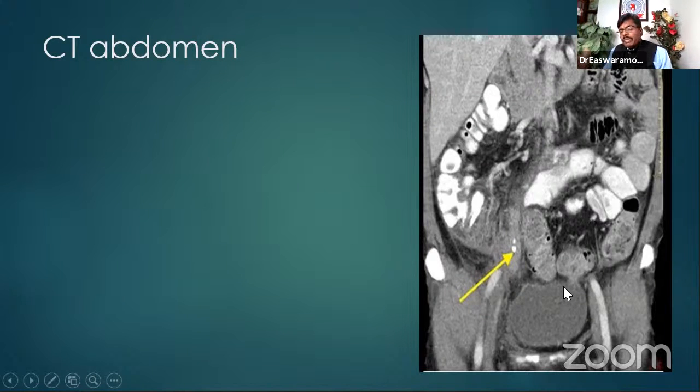Now, all these pictures I am repeatedly putting up just so you understand and comprehend. There are coronal sections and cross sections. Coronal section will give you an idea of what we are dealing with. This is a cecum, ascending colon, transverse colon, descending colon, sigmoid, like that. This is the distended bladder. This is an appendix going right, trying to enter into the pelvis.